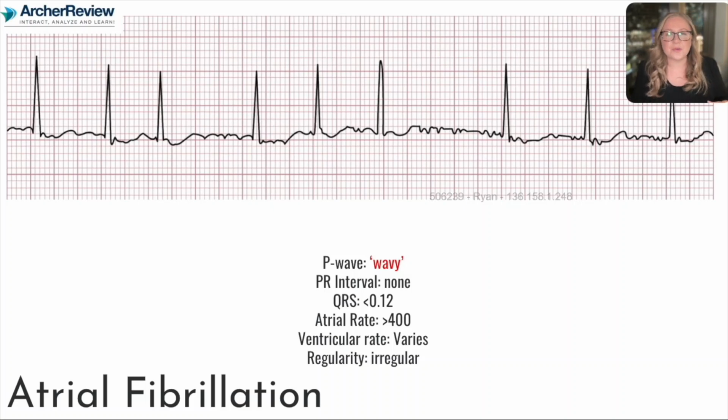The ventricular rate will vary, all right? As we see here on this screen, we have a pretty normal ventricular rate, about 90, if we count those QRS complexes and multiply it by 10. But it is irregular. We see they're bunched up, and then there's a little space, and then they have a few more, and then a little bit of a pause. They're not coming at regular intervals anymore. So this client has poorer cardiac output. They're not getting as good of perfusion.